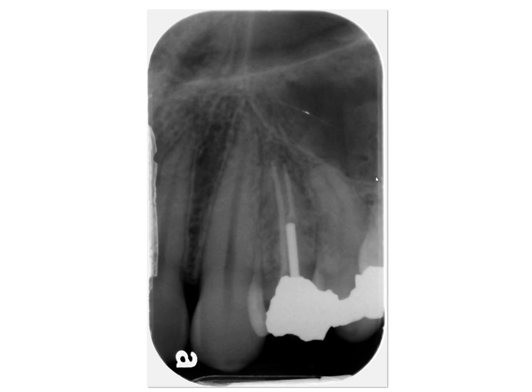So if you want to be very, very precise, at some point along the process it's a floor, but then now this is more of an anterior wall of the maxillary sinus. Anterior wall, or you could also say this medial wall of the maxillary sinus, since it's right next to the nasal cavity.